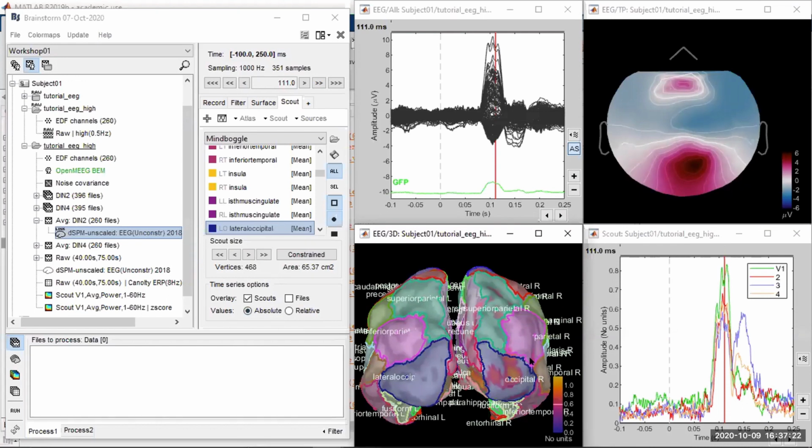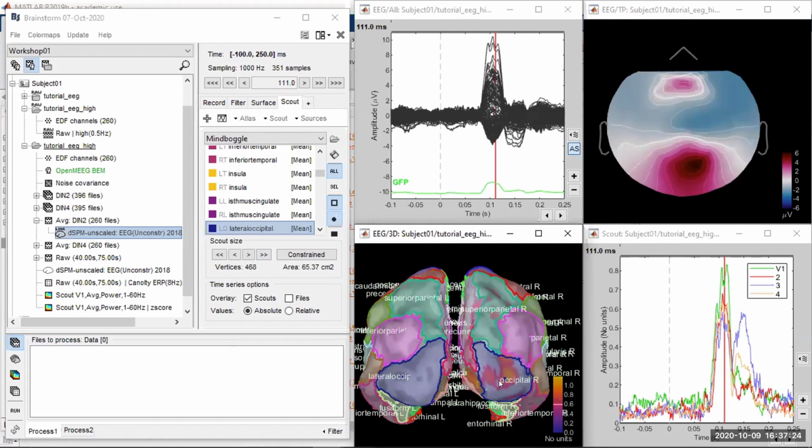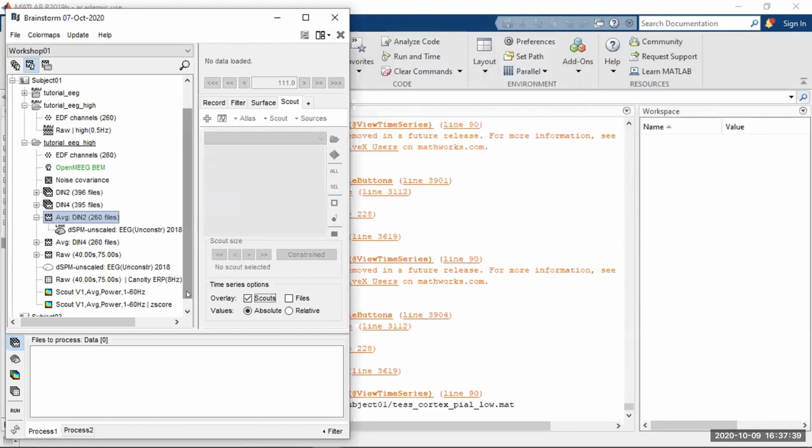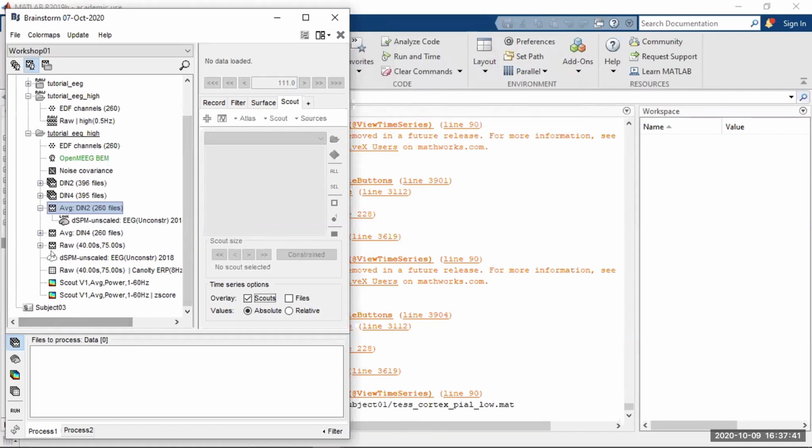So let me give you an example where we compute a very simple correlation of all of the different regions defined by the specific atlas, which is the MindBoggle. And actually, I can also give you a demo of the fiber visualization using this. So let me close all of this. Hopefully, I didn't lose all of you guys.